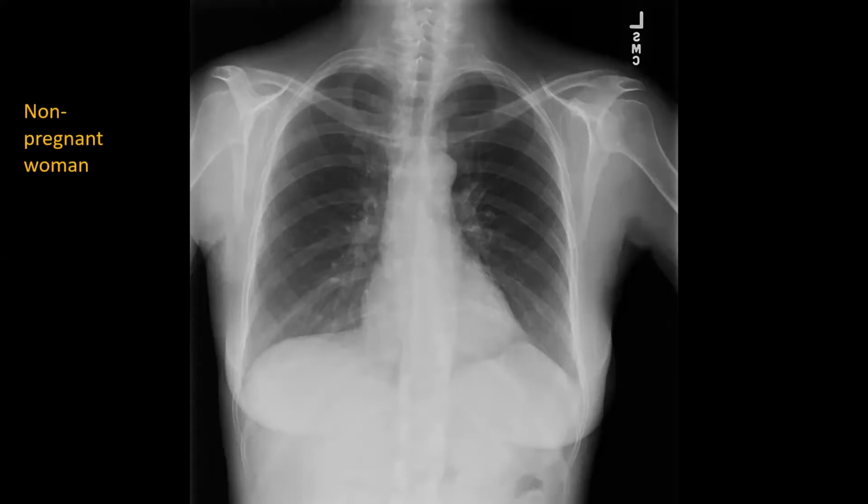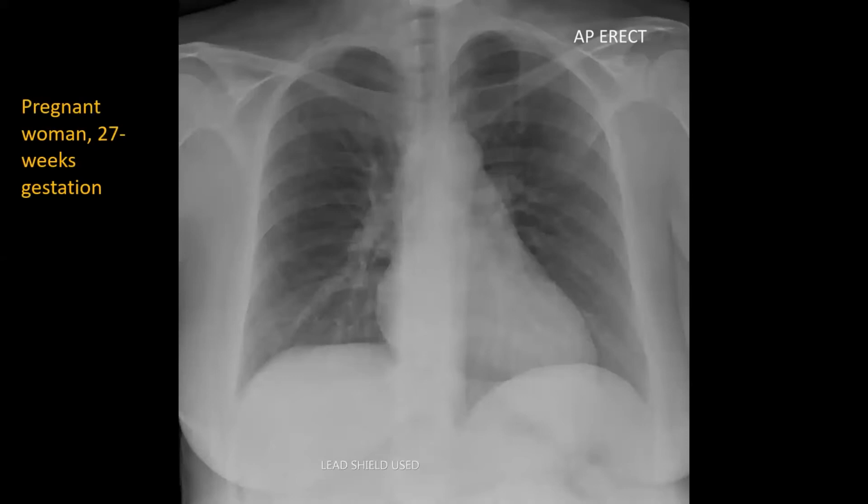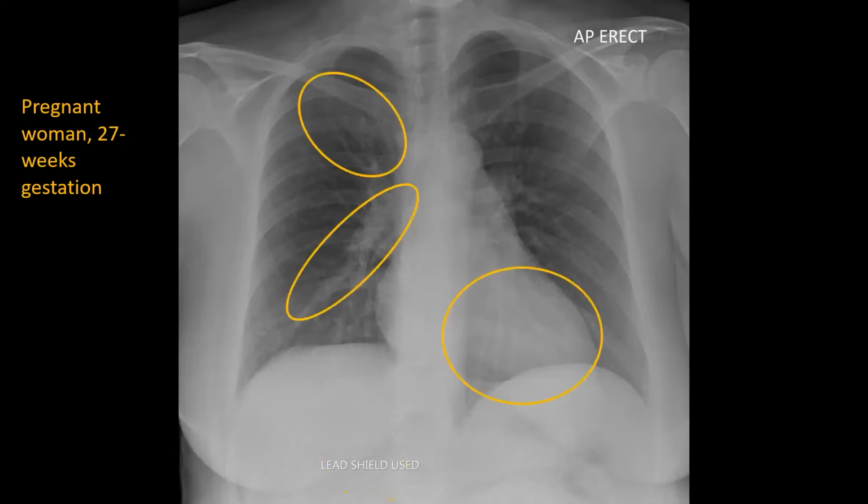This slide is just an example of a non-pregnant woman's chest x-ray. It's a nice normal chest x-ray. If you really want to nitpick, there's a little bit of tenting of the diaphragm, but it's okay. So in comparison, here is a woman who is 27 weeks of gestation. There is a note there that the shield was used. And you might pick up that the vascularity is a little more prominent than the previous film. You might pick up that that left heart border, kind of where the atrial appendage is, is a little more generous than you would expect for an otherwise young, healthy woman. So I've just highlighted those changes there.